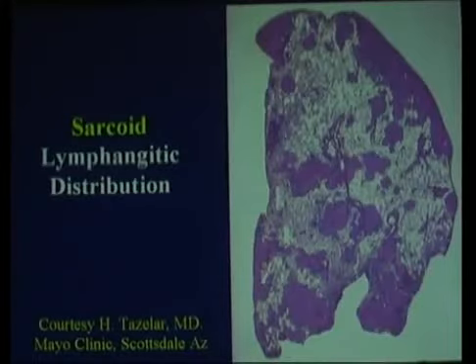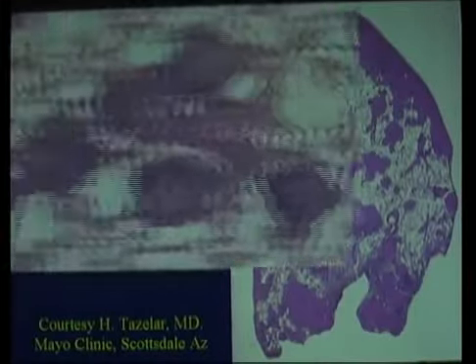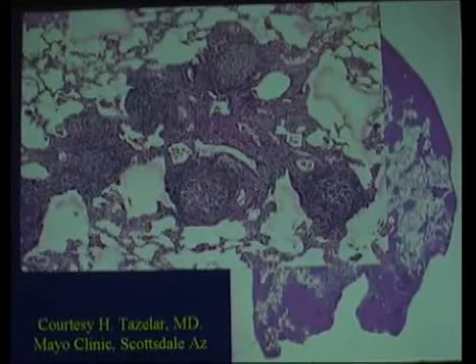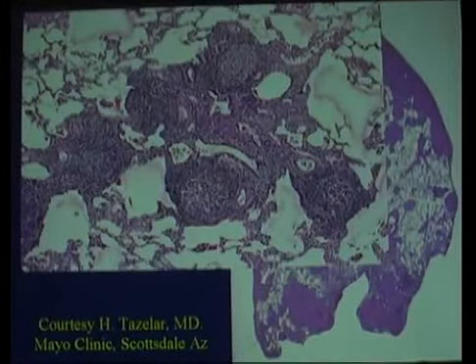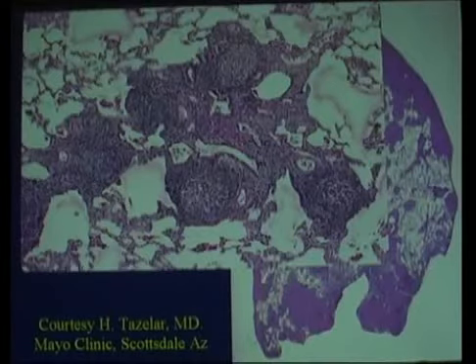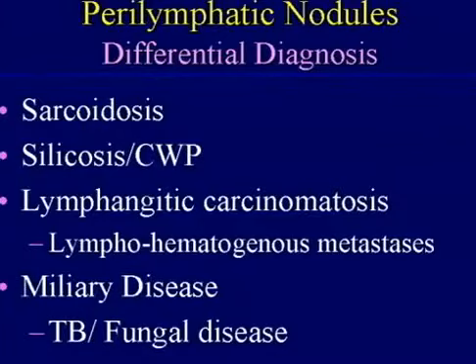Where is the disease? It's along the pleural surface, along the axial interstitium, with areas of lung intervening, very nodular in distribution. The CT clearly demonstrates what the pathology is in the case of sarcoid. And again, if you look at it pathologically, these are central to the airways, clearly non-caseating granulomas, all of them up against these airways, typical.